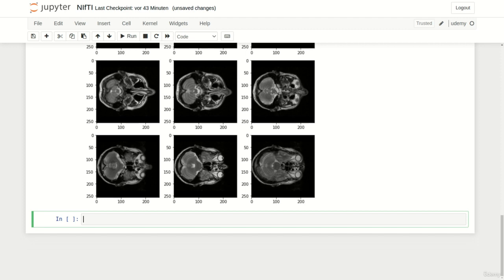We apply a very simple threshold to the image and set all pixels or voxels that have a value smaller than 300 to 0. In code, we can simply define a new variable called imageArrayProcessed and then multiply our original image array with the Boolean array returned by the statement imageArray > 300. This expression returns false or 0 for all pixels that have a value smaller or equal than 300. In contrast, it returns true or 1 for all pixels that have a value larger than 300.